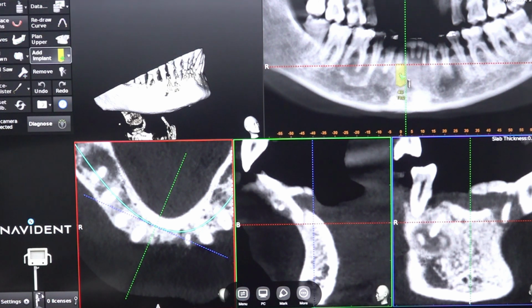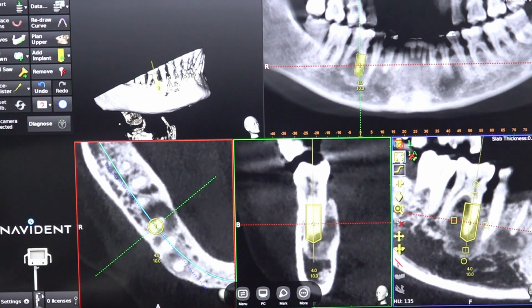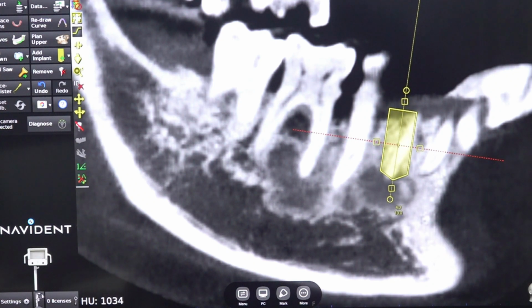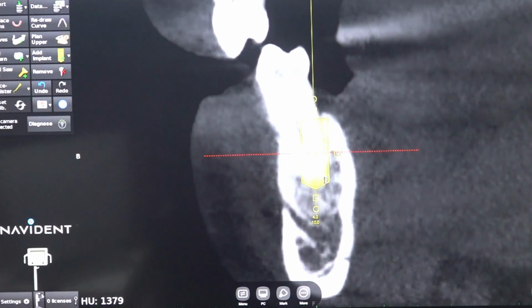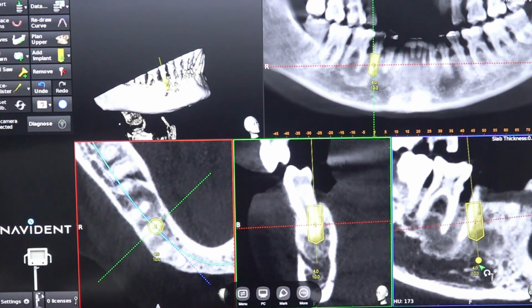So we are planning for an all-on-4 plus additional molar implant. There is a lesion here in molar and premolar, both here in molar mesial root and also in the first premolar root. So the key implant is the tilted implant, usually starting from the second premolar socket. This is the mental foramen, this is the angulation, and from here we will be tilting it mesially to avoid the mental foramen and also its loop.